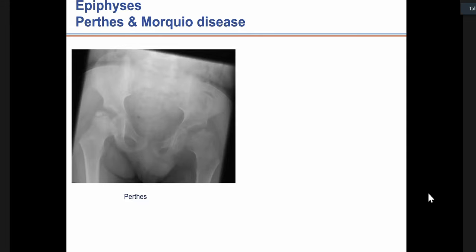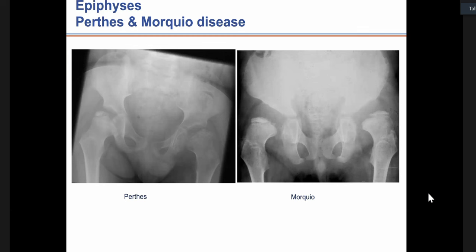It's bilateral, but you see that the right-hand side of the patient is the more sclerotic compared to the left-hand side. There's the coxa magna. The acetabula are relatively better formed than we saw in MED. And here is Morquio with symmetrical flattening, irregularity of the capital femoral epiphyses. But what else that you see here is coxa valga, which is a feature of the storage disorders. You see the flared iliac wings, and you see shallow acetabula. So these are the features that you might look for.